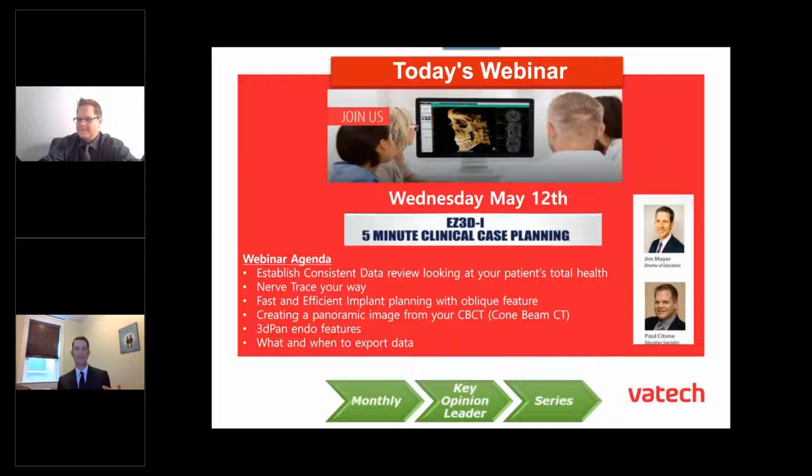What does that involve specifically with the software, Paul, that we're going to be talking about today, and different features of the software we're going to review? Yeah, so we're going to touch on some of the highlights of the software that we get a lot of questions about. We're going to trade off demoing each feature. So we're going to, like Jim said, take a look at the total scan from top to bottom. We're going to show the best ways how to trace the nerve. There's lots of different ways to trace it in the software, so we'll touch on some of the easiest ways to do it.